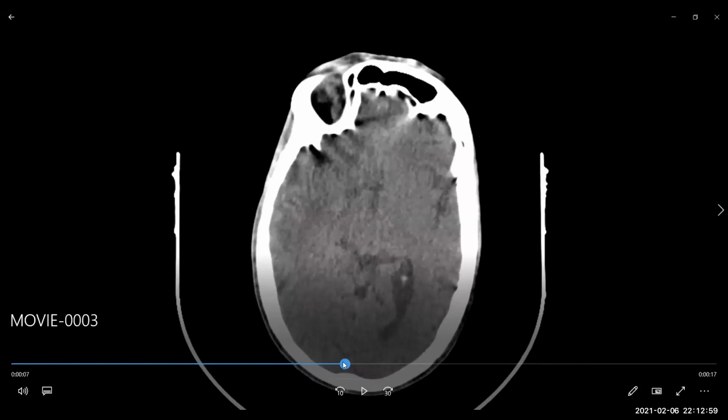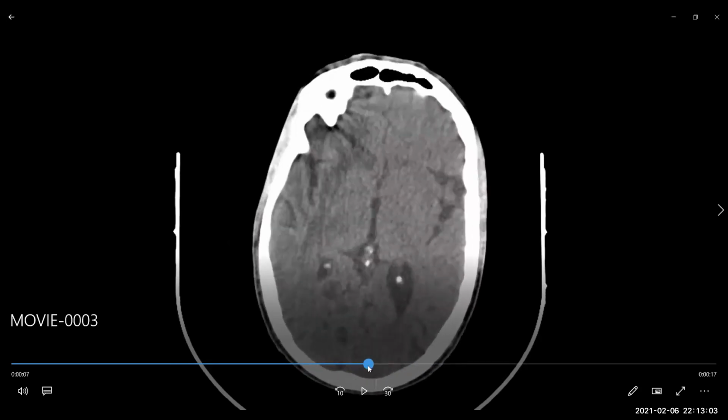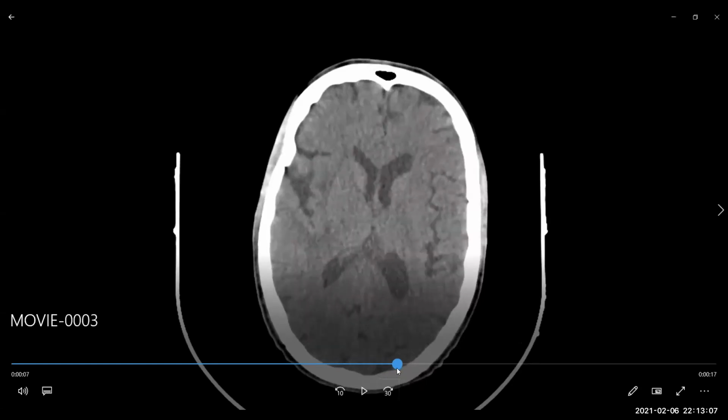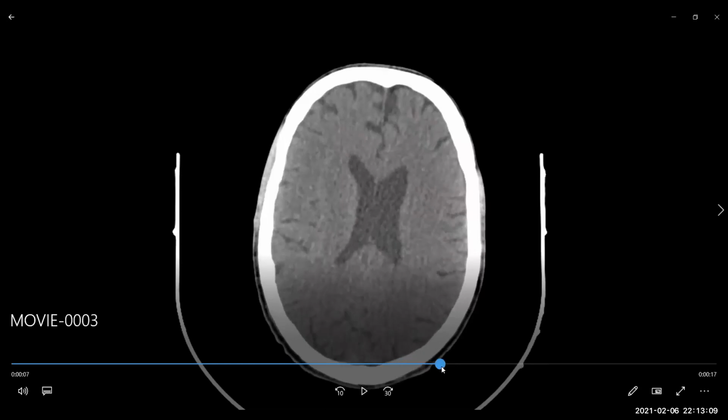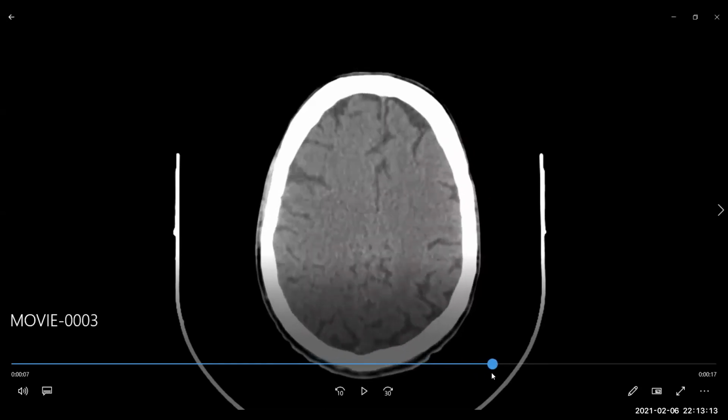I'm not seeing any obvious mass, but there is some difference in size of the ventricle that may be due to mass effect. I'm looking for any other lesions. This patient needs further evaluation with the MRI to look for any cause for this edema.